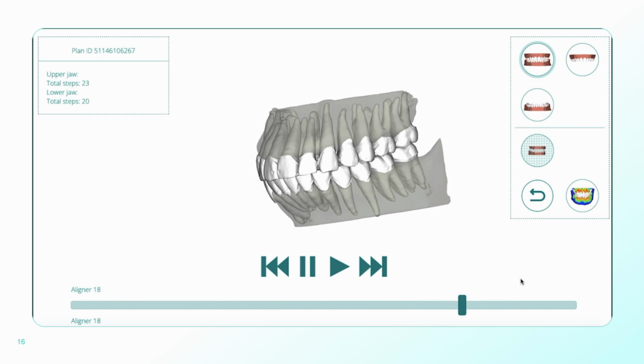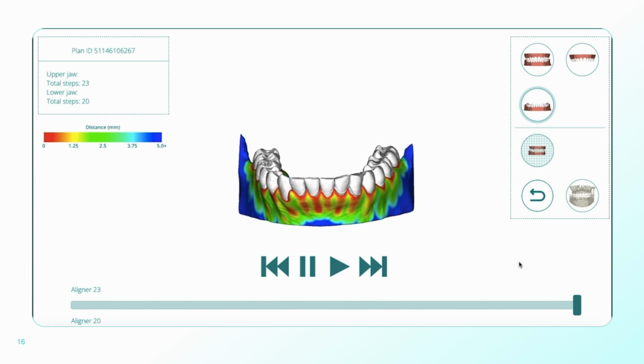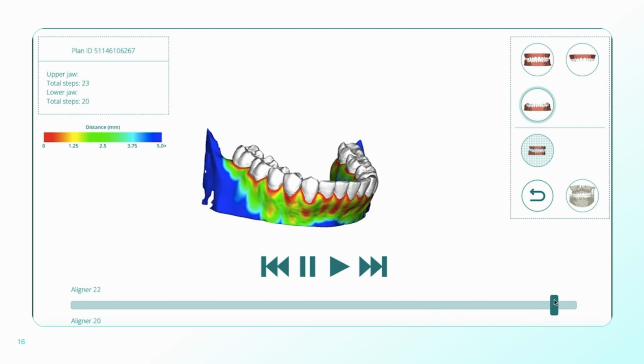Are there any collisions, any unwanted tipping against maxillary sinuses that are preventing movements, for example? Note that we will always try to prevent root collisions and unwanted movements. But if any do happen based on your prescription, we will inform you of them so you can make a decision. Once again, don't forget to check the models from lingual.